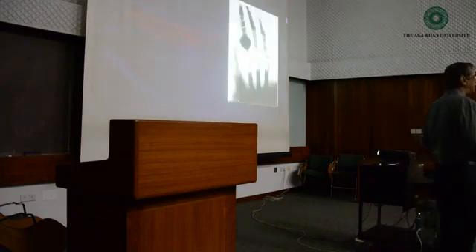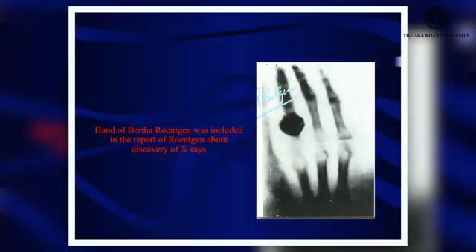This is the first X-ray ever recorded in history, and it was of the wife of Röntgen, Bertha Röntgen. It's the hand, and can you see the ring? Yes, so this was the first ever X-ray in history.